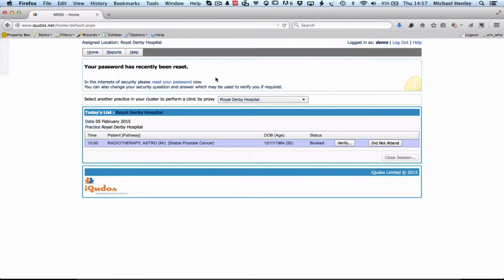Now here we have the main screen, and my mouse is moving. You can see we've got some things across the top which you can use, but you don't need to. This is where you'll be focused upon when you first arrive. So there'll be a list of your clinic patients. There's only one patient listed here, and normally it would say Dave Smith. This chap's got a name set up by the computer programmer, so we know what's wrong with him. But as I say, it would normally be, say, Dave Smith.